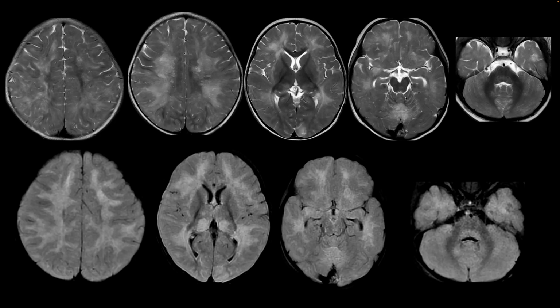Coming down to the infratentorial structures, the vermis is involved, the dentate nucleus, especially on the right, is slightly more hyperintense than normal. The dorsal brainstem is slightly more hyperintense, and there are corresponding changes again on the FLAIR sequences, with periventricular to subcortical predominance, also involving the deep brain nuclear structures, more prominently the bilateral thalami, and infratentorial involvement.